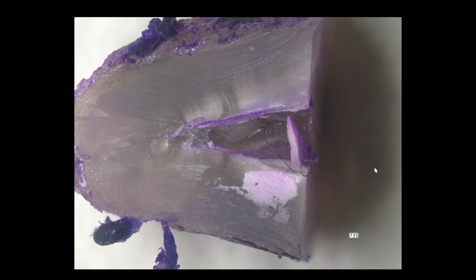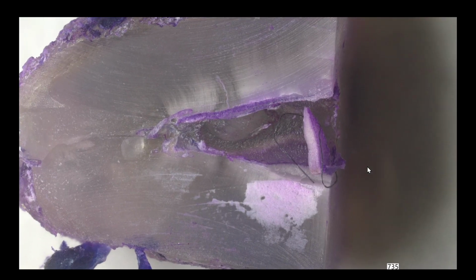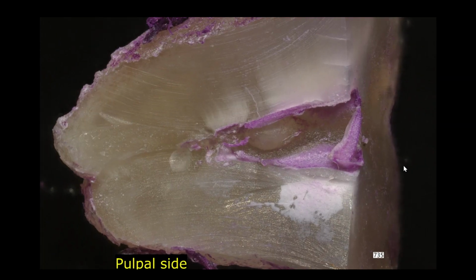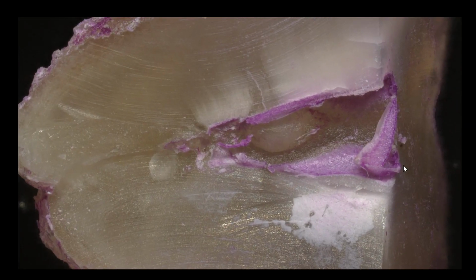And when we split it, a half of the sagittal section had pulp in it. The other half looked like all the pulp had come out and was just the clear dentinal wall. And when we looked at the dentinal wall, I was very surprised I couldn't find a single bacteria anywhere. I looked everywhere at the terminus and could not find a single bacteria anywhere.